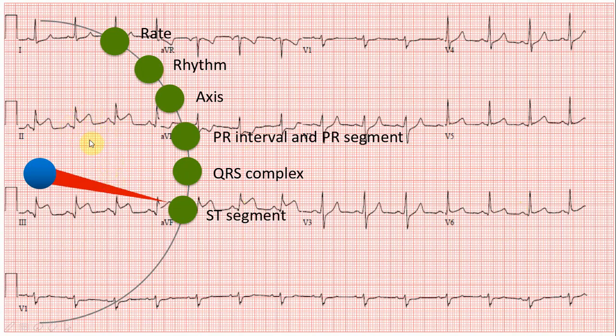In this particular patient, the ST elevation is greater in lead 3 than in lead 2. So this is a right ventricular STEMI. And also there may be some subtle ST depression in V2, which supports this diagnosis that this is a right ventricular STEMI. This is the type of ECG where we need V4R to see what is happening to the right surface of the heart.